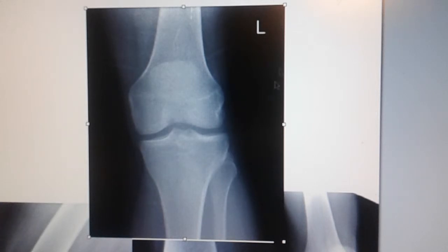Collimation, you want to have it centered. The part which would be the knee, specifically in this image, the left knee. And you want to have a little bit of the femur and a little bit of the tib fib. That's all I can think to say about that one, except you want to see the bony trabeculation and soft tissues like you do in pretty much every image. So we'll ditch that one for right now.